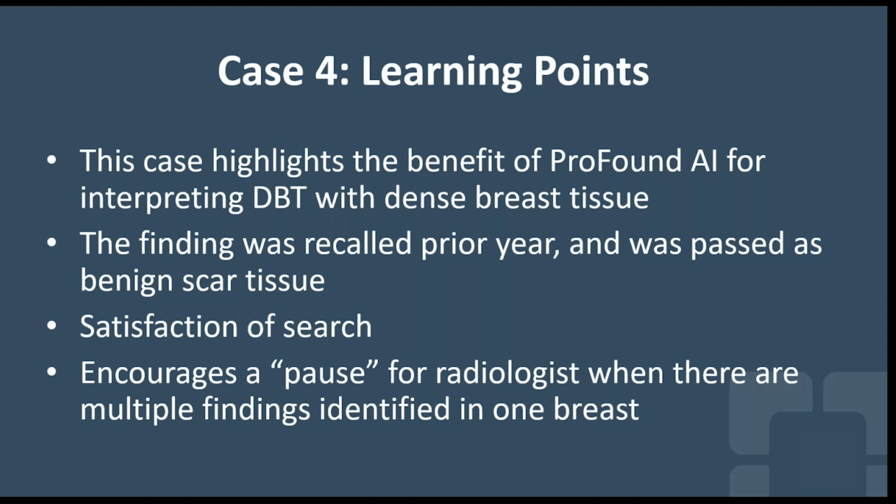I think this case is also a great example of how ProFound AI helps with that satisfaction of search element that certainly contributes to radiologist error as they're going through a busy day and seeing a lot of cases. I also like to think of the ProFound AI, and this is a good illustration of that, as encouraging a pause for the radiologist. When you have complex breast tissue and multiple findings identified in a single breast, it's really important, and I've incorporated this into my practice, to initiate that pause to make sure that I'm looking carefully at anything that the ProFound AI is detecting for me.